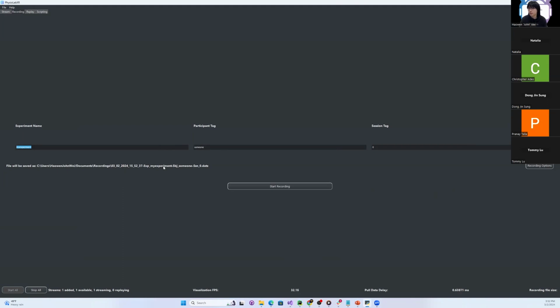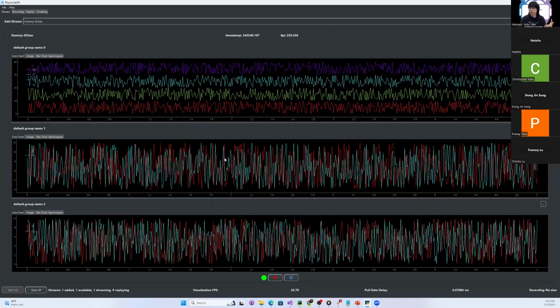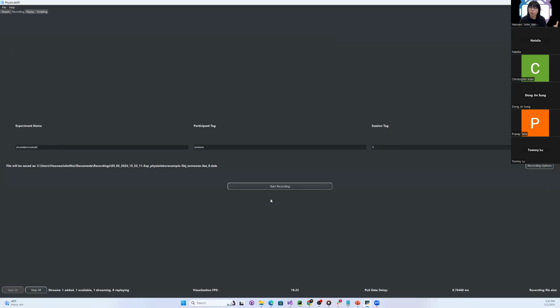So it's the time, the experiment name, the participant tag, and the session tag. For example, let's say the experiment name is PhysioLabXR example. Now, because I have a stream right here and it's actively streaming, in the recording tab we can start the recording.